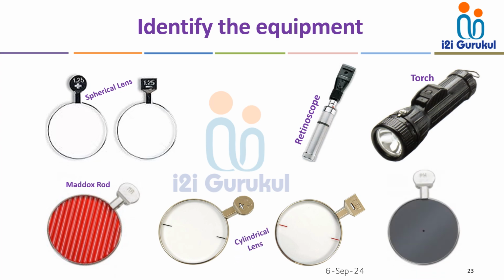And then finally we have a pinhole, which is used to check the poor vision status, whether it is because of an uncorrected refractive error or any ocular conditions that can cause visual loss.